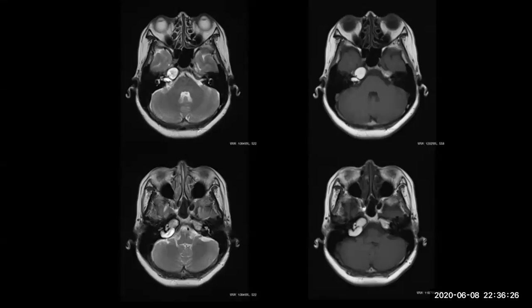Okay. What do you see? To differentiate it from cholesteatoma, because congenital cholesteatoma is restricted on diffusion. Okay, very good. These are our differentials, and this is the classic case of cholesterol granuloma. Any question on this cholesterol granuloma and its differential?